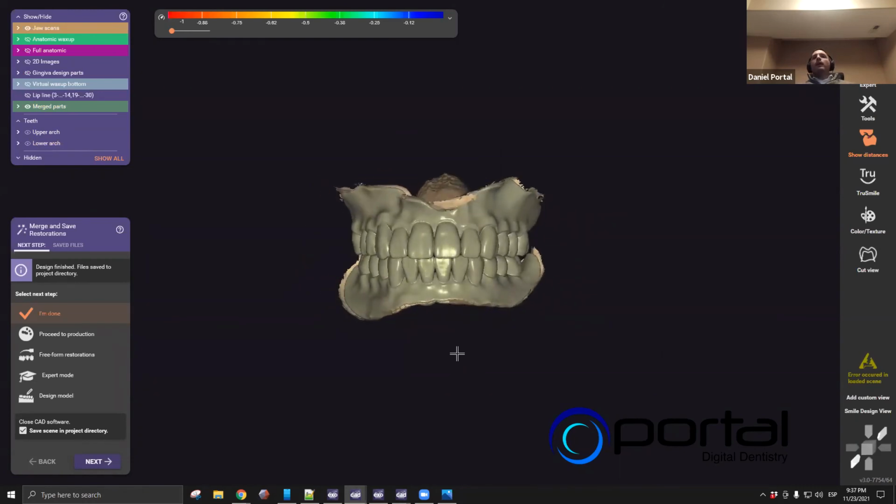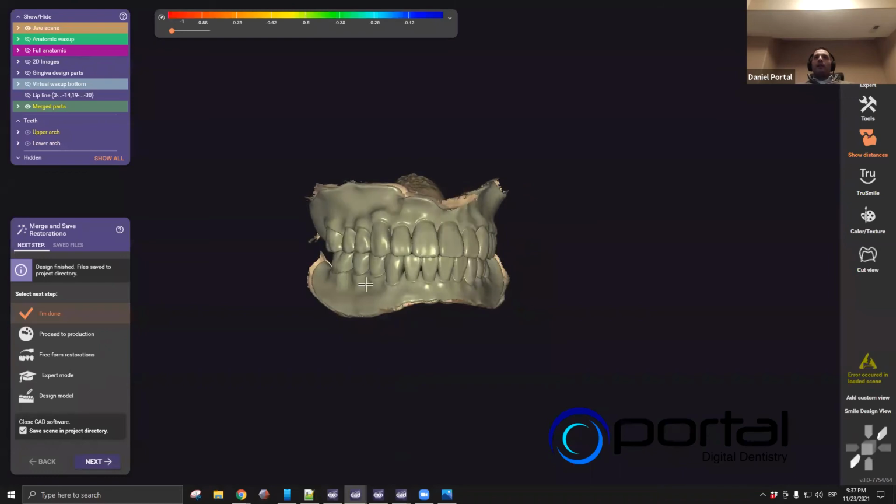And then say that is sent and the patient really likes what they receive, then I'm able to take the design that I've already done and use it the day of surgery. And so this is what I've developed with a lot of my clients. The implementation of photogrammetry has really helped in this process, because it allows for the capture and the position of the implants to be extremely accurate.